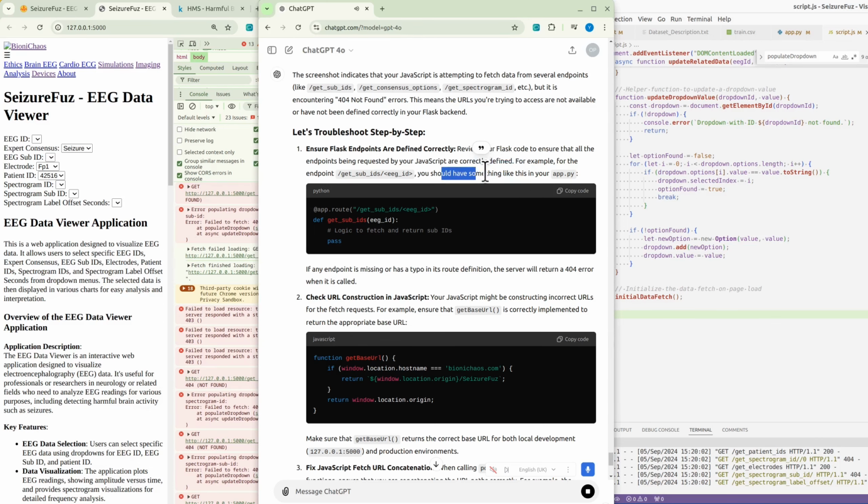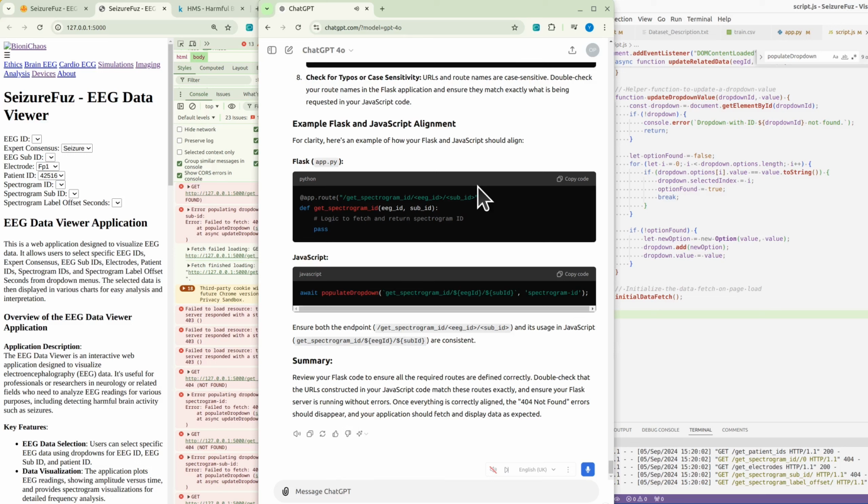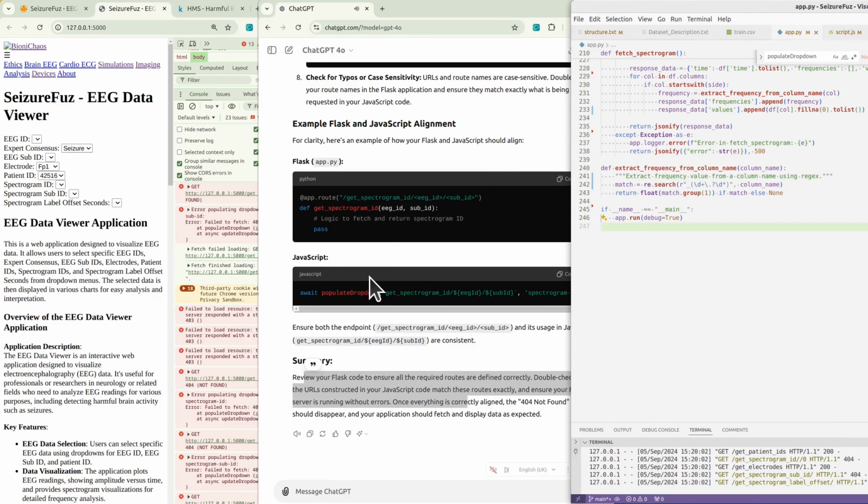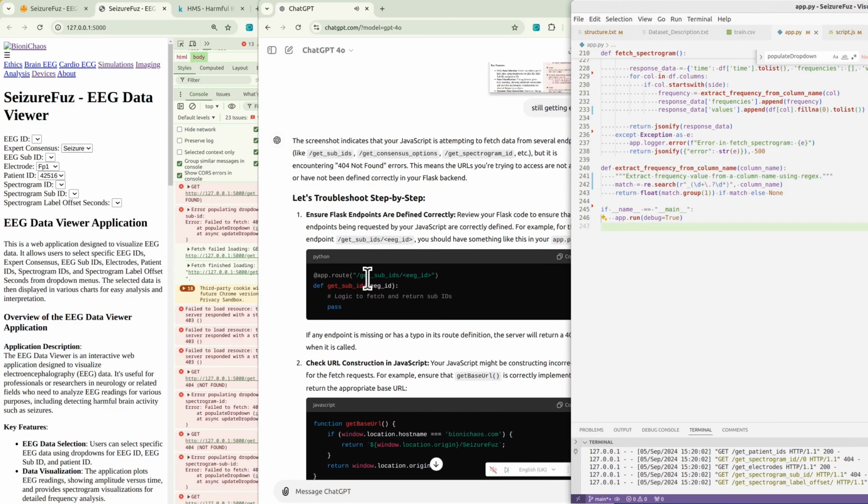If something goes wrong during this process, such as the server returning an error, our code catches these issues gracefully and logs a friendly message in the console. This means no more mysterious failures or blank dropdowns, just clean, well-handled errors that make debugging easier.